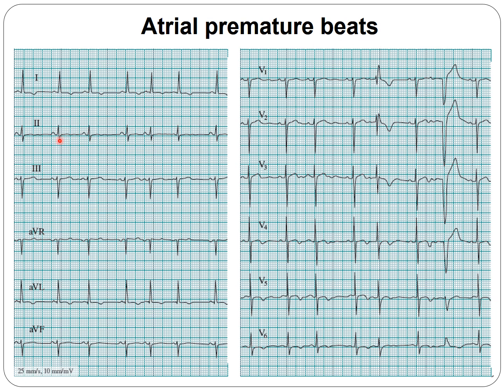Looking at this graph, you can see this is arrhythmic. By looking at which one is out of order, I could stop this one, for example, that's a premature beat here. That could be a normal one, that's another premature beat, that's another premature beat. If you compare the P wave of these two, it's a different one. In AVL, you can see much bigger differences because in AVL, the normal sinus has a teeny tiny P. However, in the premature contraction, there is almost no P wave.